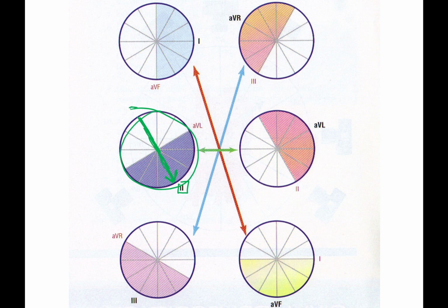The 2-lead is negative on this end and positive on this end. So, at the halfway mark on this system, you can then assume that the colored in half here is positive and the white part is negative. Simple as that. Now let's take a second and look at the 1-lead, where it's the same idea, that the 1-lead travels this direction, positive here, negative here. So if you divide it in half, this is going to be the positive and this is going to be the negative half, right?